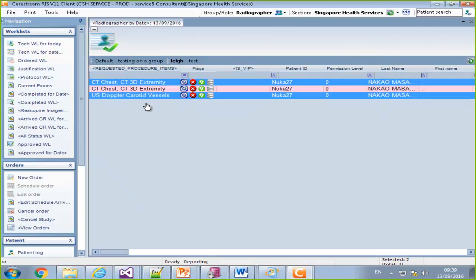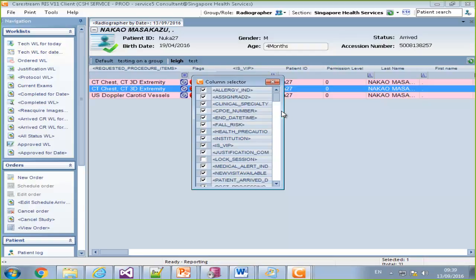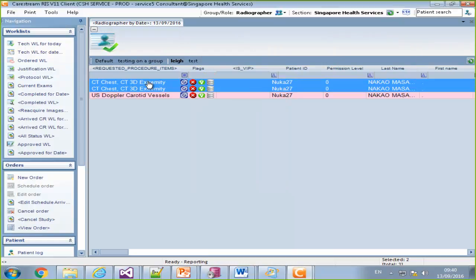Otherwise, if you can see those studies, no, this is not a good example. What are the studies? Chest. Yeah, but I don't remember which one. We created more. Even changes the same study. Right, I don't have the study here. We don't have the study column. I want... Okay, never mind.